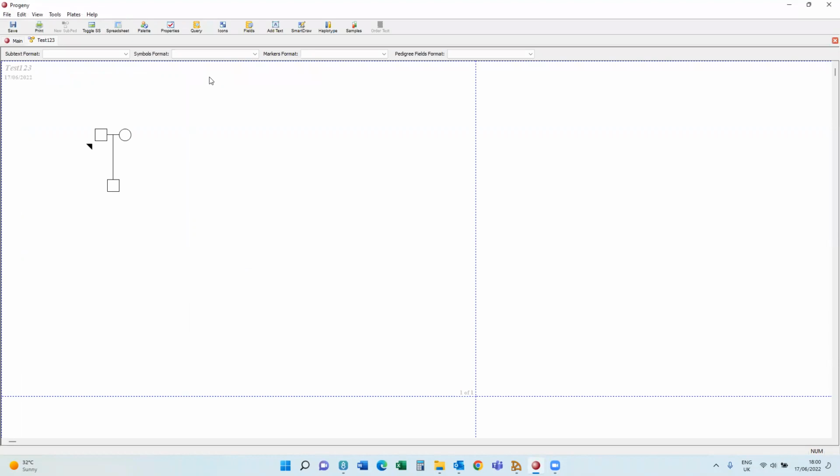Today I'm going to be creating a video to show you how to do BOADICEA exports from Progeny. This is going to be the first of 3 videos. Today is going to be the simplest, looking at a fresh Progeny database, auto-creating the fields, and then just exporting. The second video will be focusing on using an existing Progeny database, using the fields and tables that you already have in that database to populate and export into the BOADICEA format.